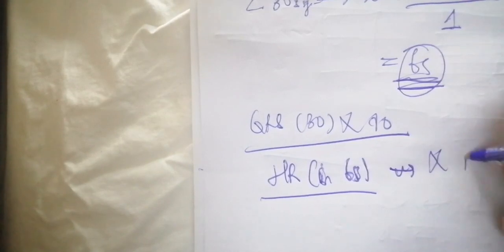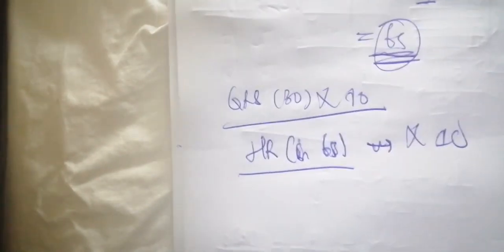It means that is the heart rate in 6 seconds. So to get your heart rate in 60 seconds, you must multiply by 10. Are you understanding why in the rule of 6 you multiply by 10?